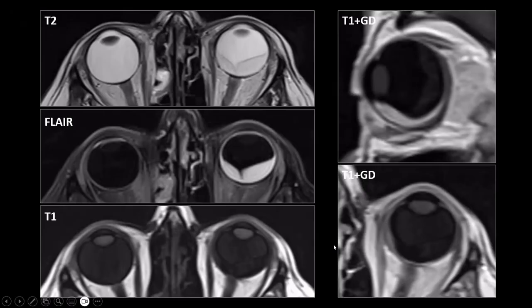This was a patient with breast carcinoma. And if you see a retinal detachment in a patient, especially in older patients, especially in patients with a history of malignancy, definitely do contrast-enhanced sequences, because a cause for retinal or choroid detachment can be an underlying ocular neoplasm, as was the case in this patient.